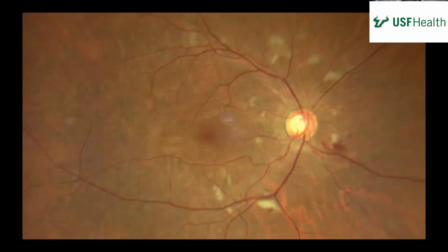So we have a fundus photo of the right eye. The media appears clear. The vessels have some mild tortuosity. The disc looks pink, sharp, and flat, but it does have a large cup, 0.6 to 0.7 or so. Attention is drawn to the macula and the periphery. There appear to be quite a few white lesions. It's suspected cotton wool spots, and then hemorrhages in the peripapillary area.